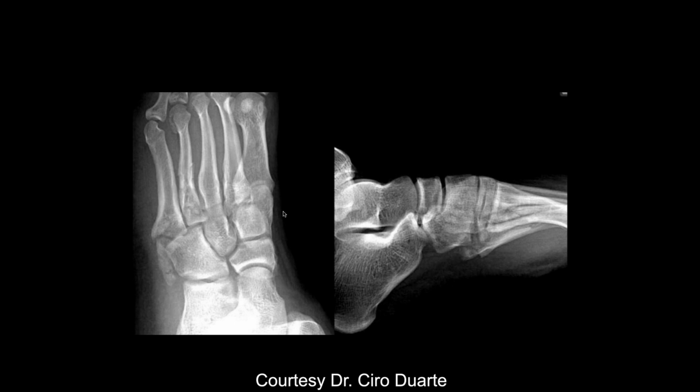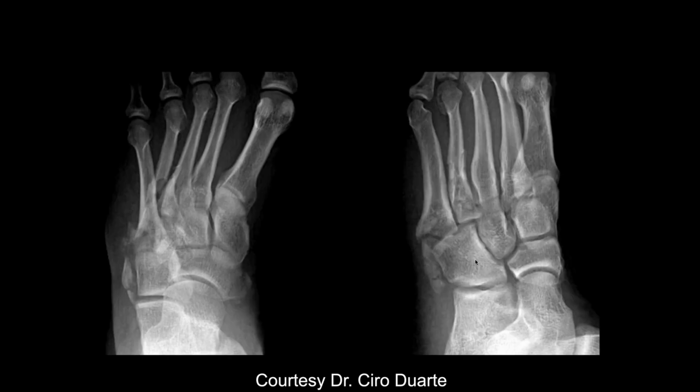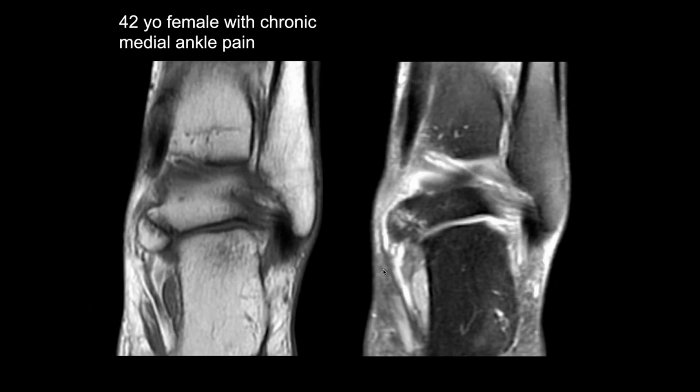Just proximal to the fifth metatarsal base, there is some calcification, maybe an ossicle there. It's pretty big, and there's fractures of the fourth metatarsal proximally, and it looks like the fifth metatarsal is also fractured. Looks like a lot of metatarsal fracture, a lot of trauma here. This is actually an os peroneum in this location. It's within the peroneus longus tendon, and it's actually fractured along with the other bones that were fractured there.